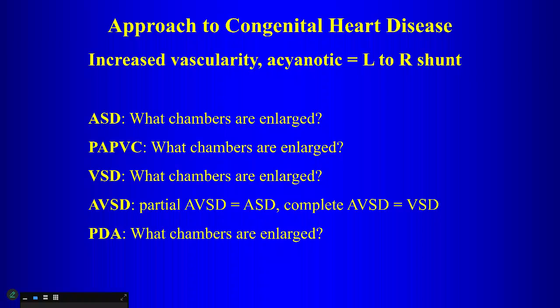Now this becomes very easy. Just remember, ASD, right heart enlargement. PDA, left heart enlargement. VSD, biventricular and left atrial enlargement.